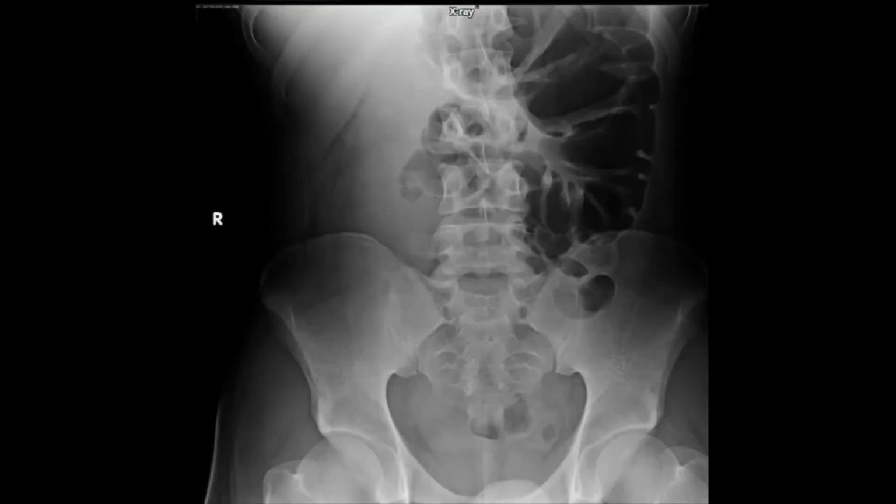So now we'll move on to our cases of cecal volvulus, and here again you can see some dilated bowel. This is large bowel, and you know that because you don't have the thin lines going across the entire bowel loop, which would be valvulae conniventes, which you see in small bowel. Here you have the haustral markings, which do not span the entire bowel.